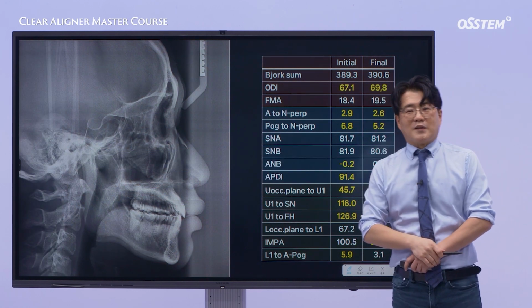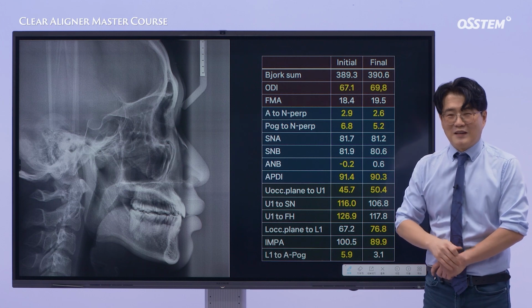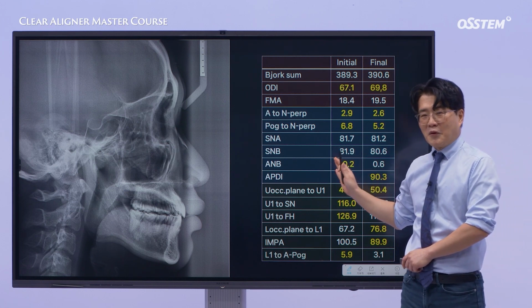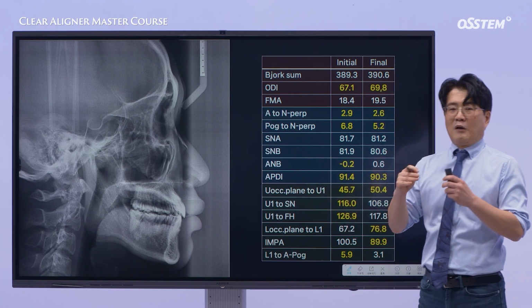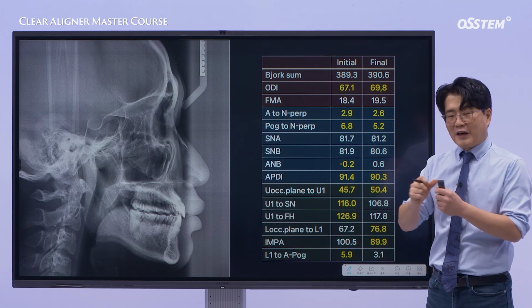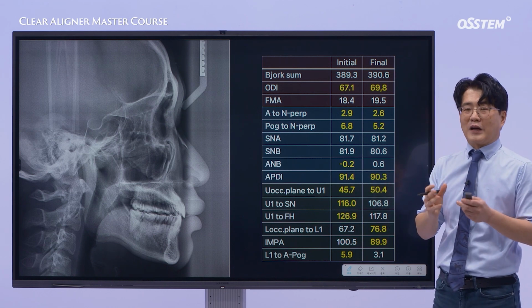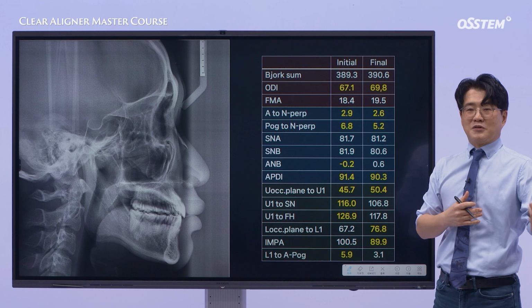So, what do you think? Do you feel comfortable handling a case like this? Now, the case I showed today highlights an important advantage of clear aligner treatment. Using the web viewer, we can request first and second treatment plans, use them to make informed decisions, and offer patients a wider range of treatment options.